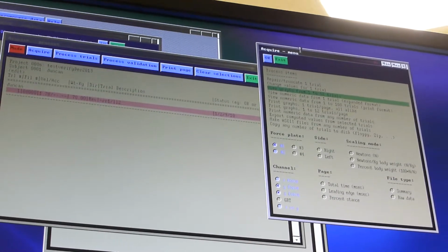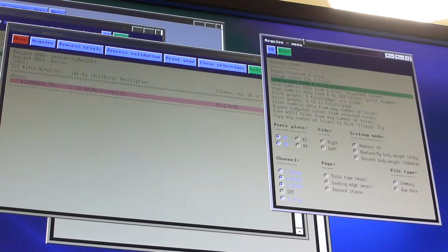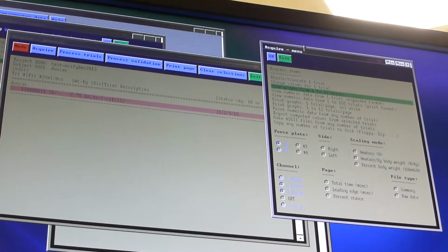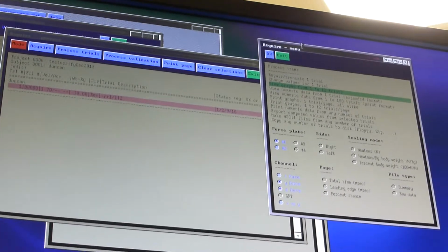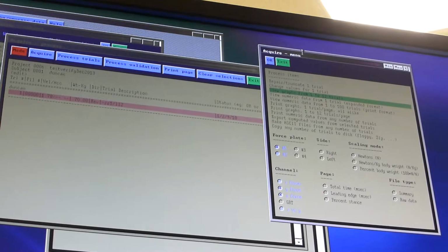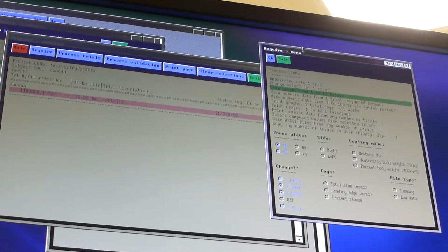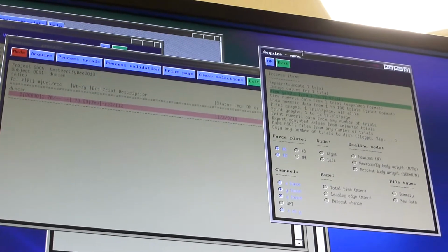All right. The reason I ask that is that the physical plate numbers are what you enter into that notation for 1 and 2. And the reason I tell you that is that if you do a series of trials, it will overlay the graphs for consistency. If you happen to walk in both directions, some people alternate directions. First you go one way, then you go the other way, and alternate back and forth.